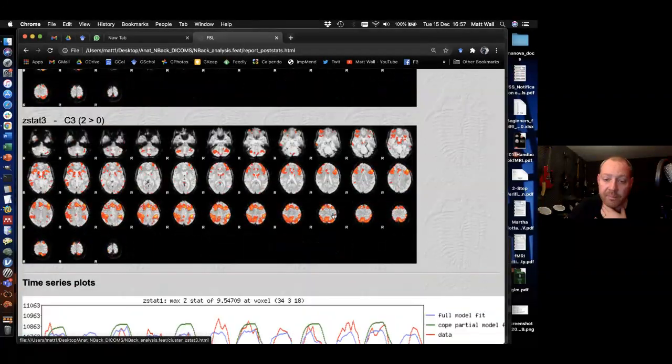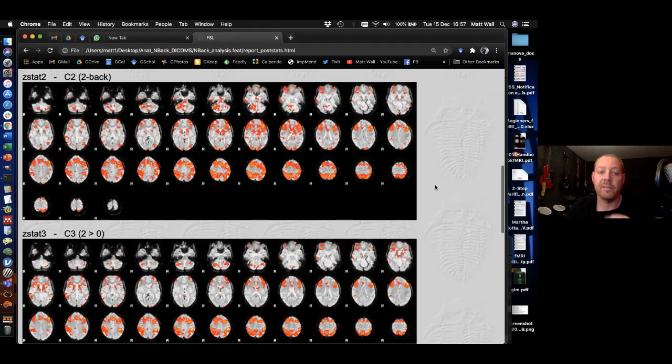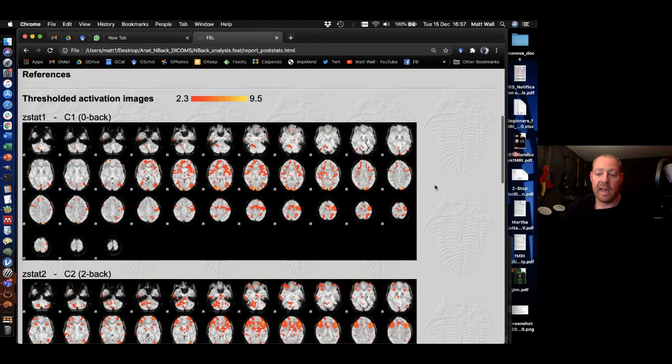We're not seeing that because it's the same in both the conditions. We're subtracting it out, it's all summing to zero. What we're seeing are just the parietal and dorsolateral prefrontal cognitive areas. Yeah, there's a bit of noise and stuff around, but it's only one subject. We're seeing that nice working memory circuit isolated really nicely in this comparison. Glad that worked.